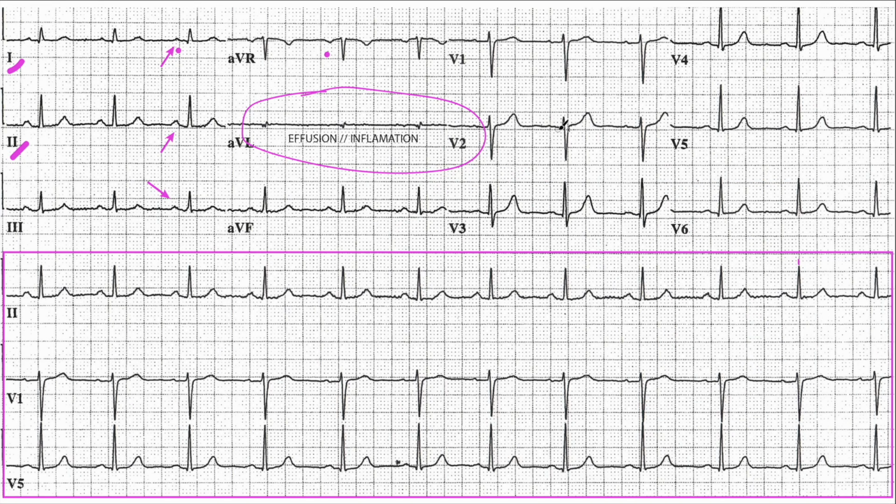Okay, now let's get back to the ECG. Looking at this ECG, right? Here's my R wave, starting off nicely, and then boom! Look at this. This is a huge shift. This is a huge shift. It went from something very small to a huge shift.